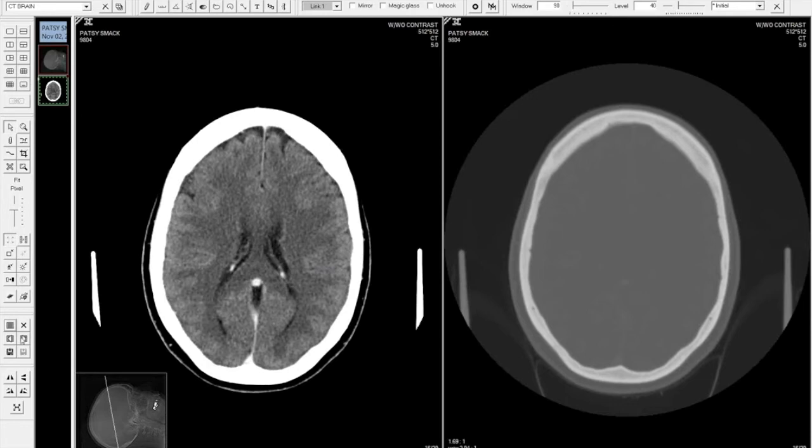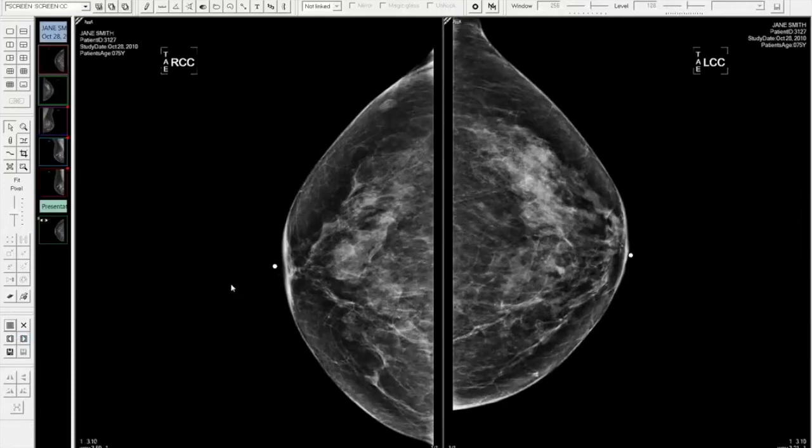We're going to get a little more complex now. Digital mammography is the next big thing. Everyone has, or not many people have, dedicated mammography workstations. eRAD now has a module that one can use, and in that module is included what we call hanging protocol sets.